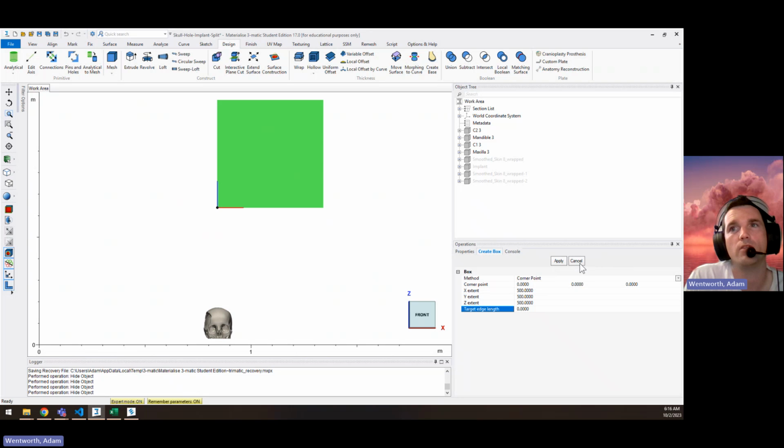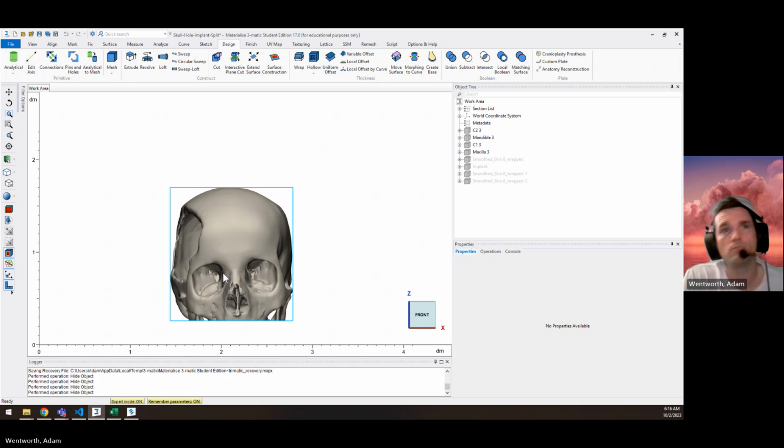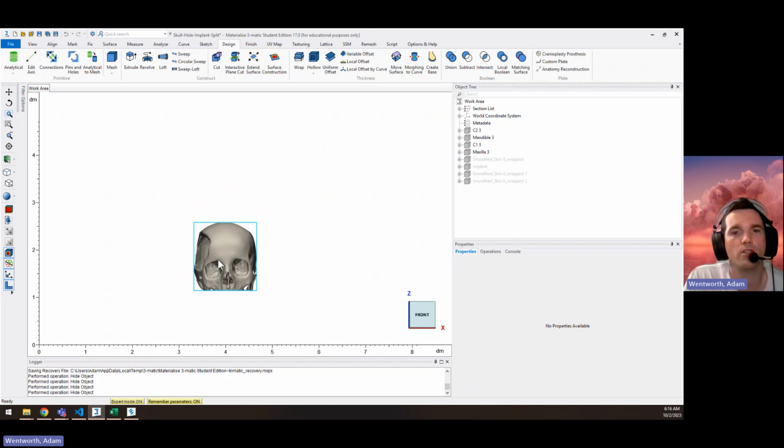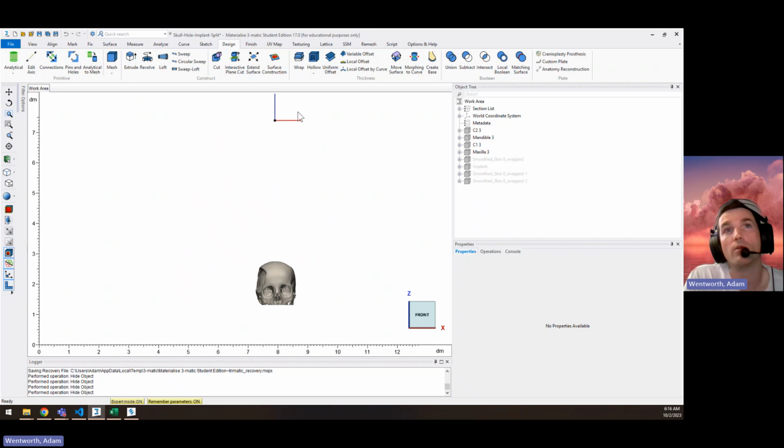The other thing is if you're doing some research and you would prefer everything to have the coordinates positioned in a very specific way, so you don't have to do a lot of math after the fact. You maybe can align something with the world coordinate system so that your output analytical calculations could be more simplified.